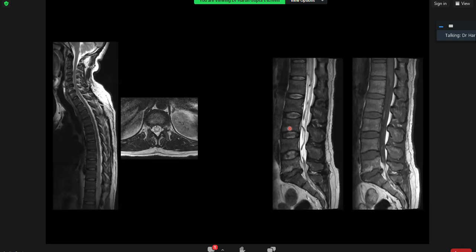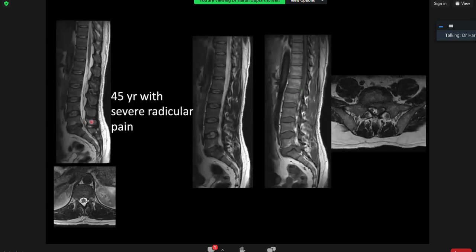Patient comes back a year later with paralysis. And at that time, the patient is noted to have diffuse cord edema. At that time, we see these large vessels within the central canal in the cauda equina. Essentially, patient has spinal dural AV fistula with cord congestion. And if you look at the previous imaging, it was there. This linear vessel was there.